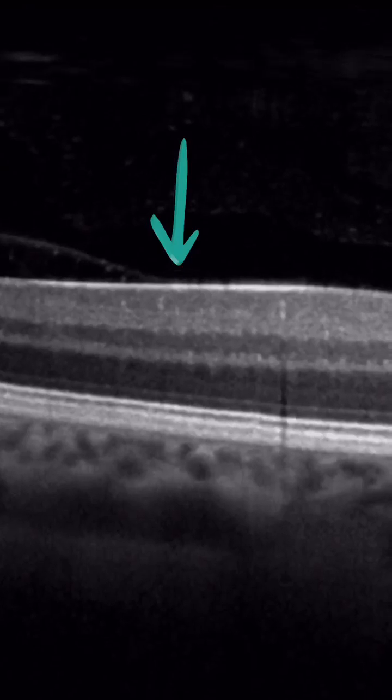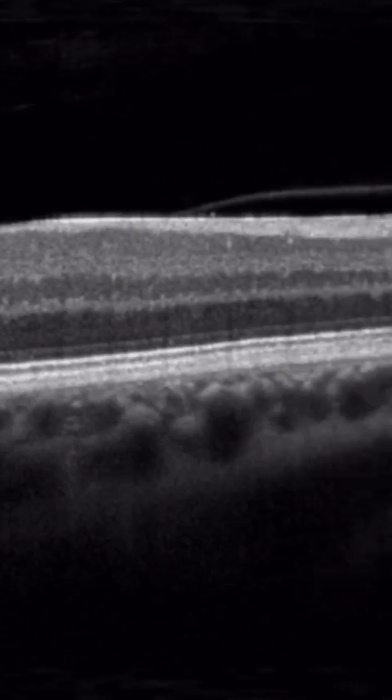Now the next thing I look at is the RNFL. This is the first hyperreflective layer you can see here, and if you go on the right side, the RNFL is thicker. Because the RNFL is thicker on the right side, that tells you that this is the right eye. On that side, the optic nerve will be coming just after the end of the scan. After this, I don't spend too much time in the inner layer of the retina. I go right away into the outer retina, the RPE and the ISOS.